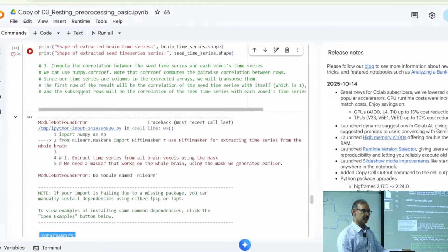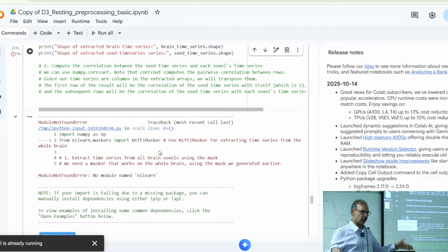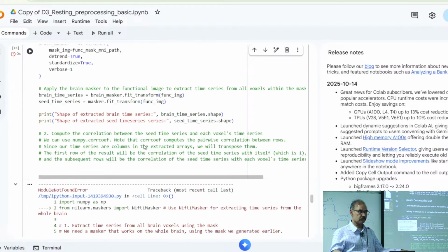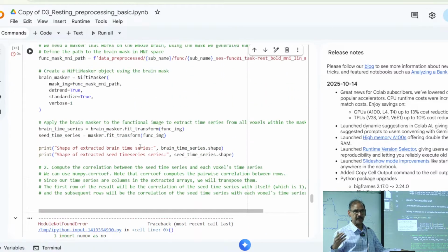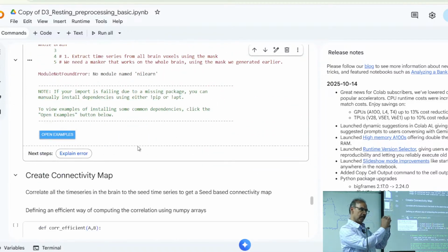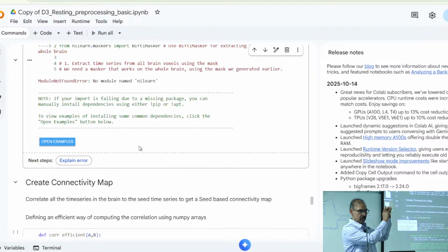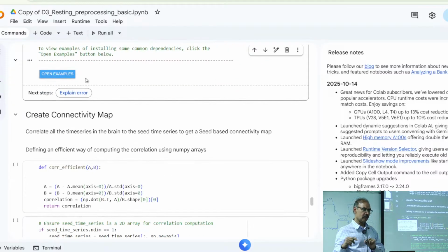So with the time series, what we do is we take the average time series, which will have how many data points? 818, right? Because that is the time series. And then we are taking that time series and starting with 000 001 all the way to 64, 64 by 36. So we will do it for the whole volume, okay?